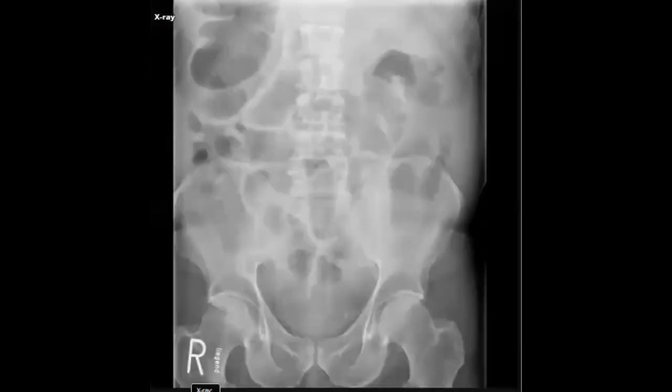This patient developed abdominal pain, and when you go to check the abdominal checklist, which is important to comment on in the emergency, yeah. What is the emergency? It will be here. The air fluid levels and the dilatation of the bowel loops.